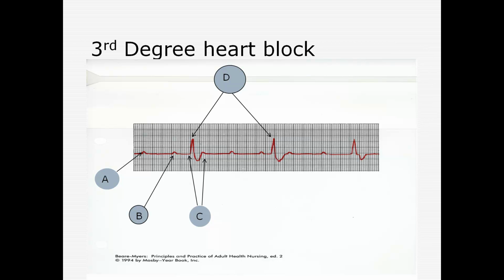Now remember, the normal beats per minute, if the ventricle initiates the heartbeat, is only between 20 and 40. Notice this one on a 6-second strip, we only have 3 beats. That's 30 beats per minute. People can't live with 30 beats per minute.